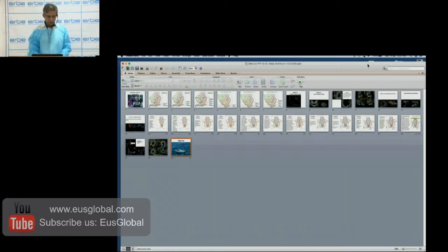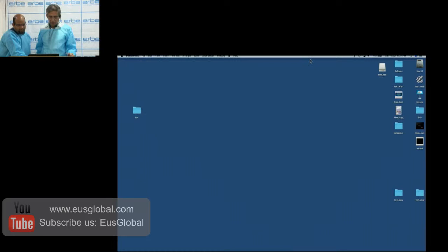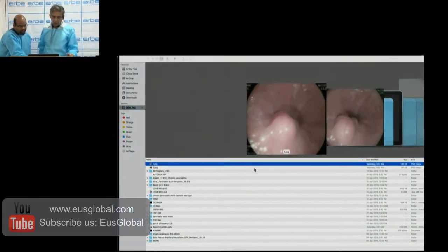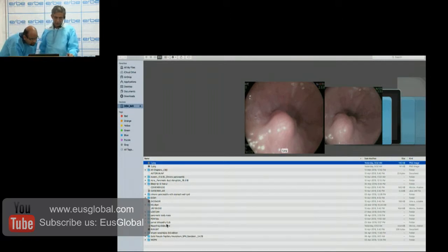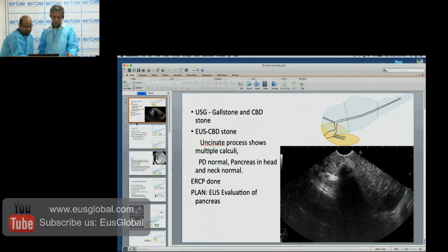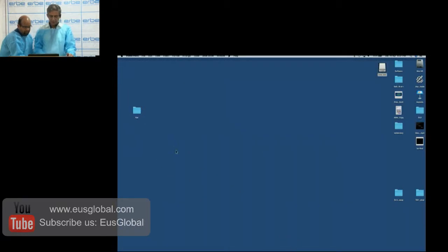Rahul, I want one more interesting presentation to show, and that is how to do reporting. We have shown you a couple of interesting things. How do you decide a tumor and all that? But this is a simple image, how do you report? This is the reporting software, right? That one now. Okay, yeah, this is the one.